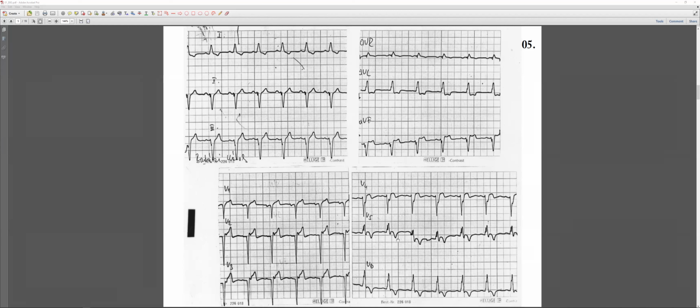How can you diagnose a right or left bundle branch block? I'm blanking, I'm sorry. Which lead should you look at on the right side and the left side? You should look at V1 and V6. Whenever you see the elongation of ventricular activation time or the wide R wave, the block is there. So the wide R wave in V6 would mean it's a left. Exactly. So that's a left bundle branch block.